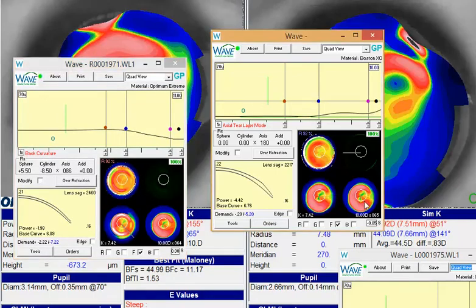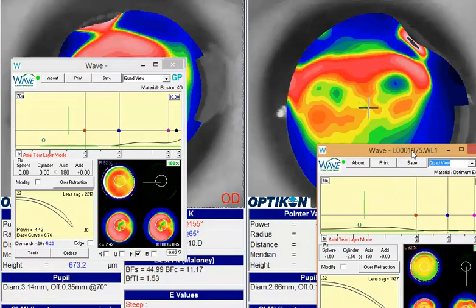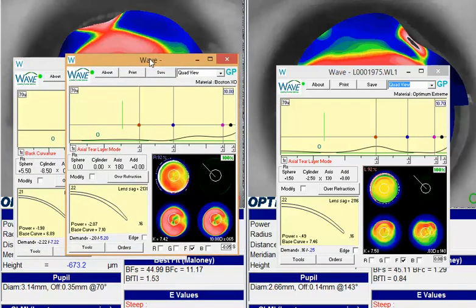And if you compare that to the left eye, which is fitting reasonably well from my understanding, pull that left lens up. You'll see that the left lens back surface, the lower left, is very similar to the front surface of the topography, and you'll notice if you follow that simulated fluorescein, you have a lens that pretty nicely aligns all the way around. In this case now your right lens is much more closely aligning. So again, I think those little subtle adjustments will make a big difference for you.